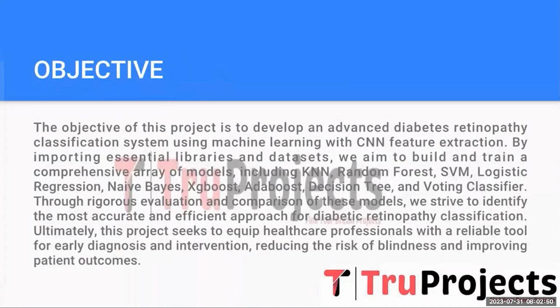The objective of this project is to create an advanced diabetic retinopathy classification system using machine learning. By importing the essential libraries and using various machine learning models like KNN, random forest, SVM, logistic regression, Naive Bayes, XGBoost, AdaBoost, decision tree, and the voting classifier. Through rigorous evaluation, we seek to identify the most accurate and efficient approach for diabetic retinopathy classification. Our primary goal is to empower healthcare professionals with a reliable tool for early detection and intervention, potentially saving patients from countless sight-threatening complications and improving patient care.